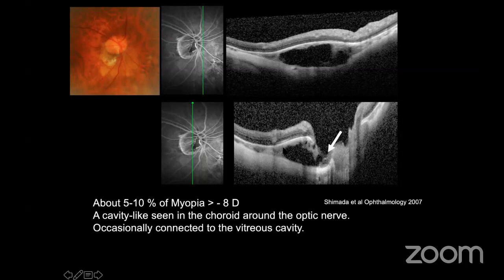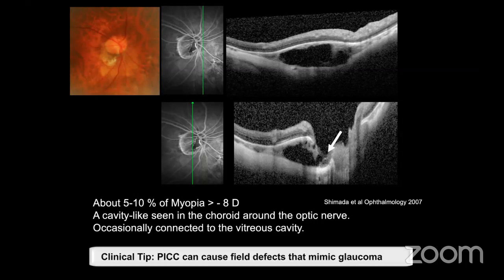The cause of the fluid within the cavitation is unknown, but it's thought to be coming from the vitreous one way or another. Clinically, as you all know, analyzing the optic nerve in highly myopic eyes is often challenging. And with the presence of peripapillary intrachoroidal cavitations, we occasionally see visual field defects that could mimic glaucomatous changes. So we can keep that in mind when we are checking these cases.